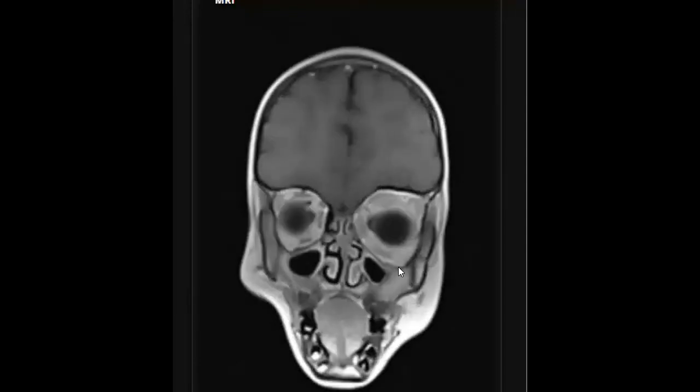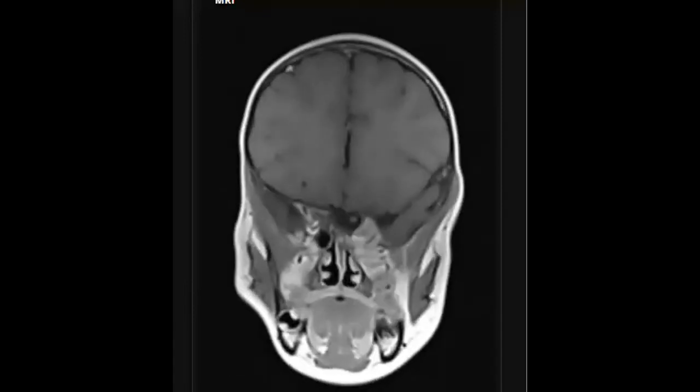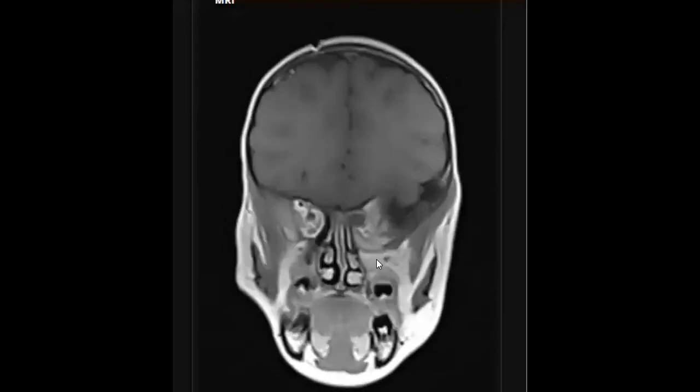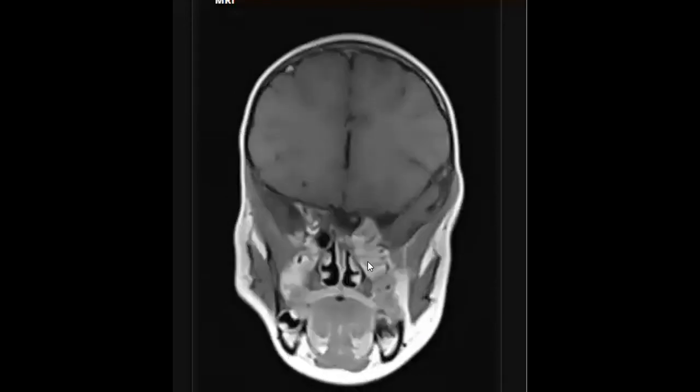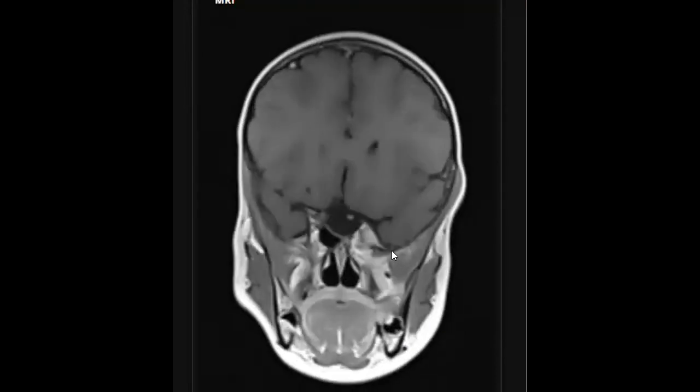Yes, Dr. Rania, Fatma, perfect, yes. So, Rania, I think it is what is called bare orbit. Especially in the T1, when you find the sphenoid bone on the left side has deficiency or maybe dysplasia, and you find proptosis in young age, you can think about neurofibromatosis.